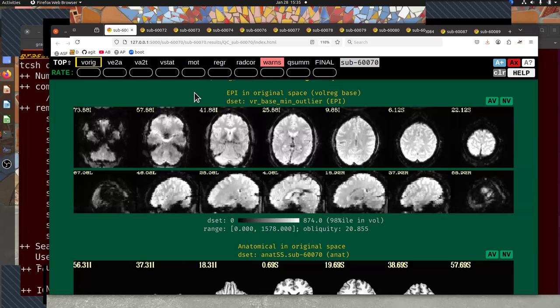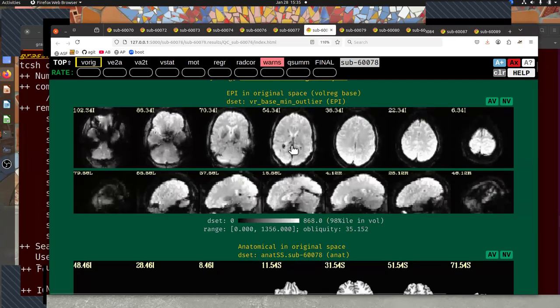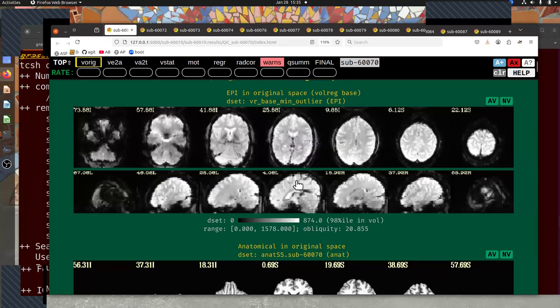If I have any question, I can dive across properties across a subject at the same time, but in this kind of matrix of ways, that's why I think about it. So I can very easily see that all these subjects in their original data have similar tissue contrast, similar field of view, coverage, all sorts of things like this. Okay, so this is okay.